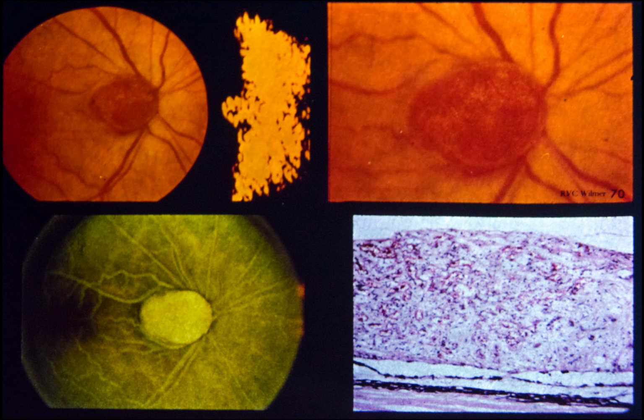Lower right, in histologic section from another patient, note multiple dilated capillaries filled with blood, indicating that tumor is a capillary hemangioma. Comment: this patient had good visual acuity and no treatment was recommended. Other investigators have reported significant complications after photocoagulating angiomas on the disc.